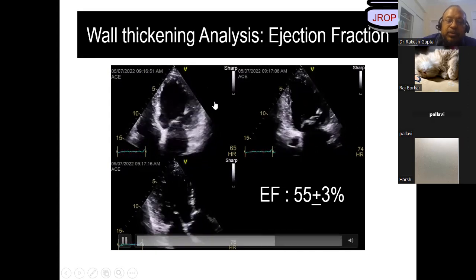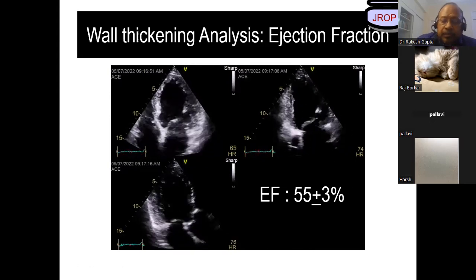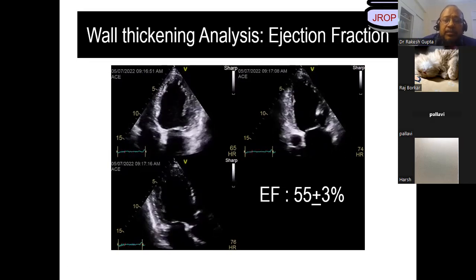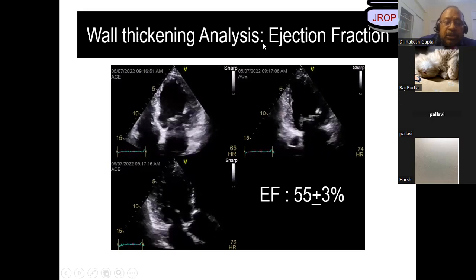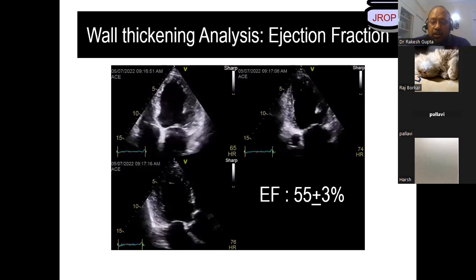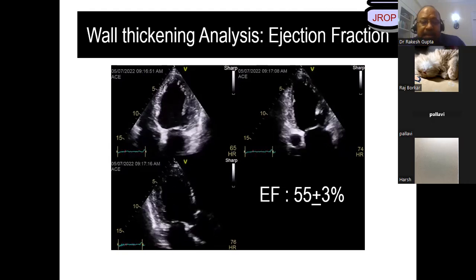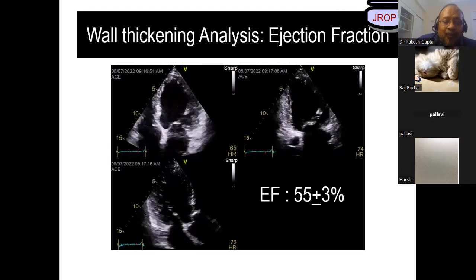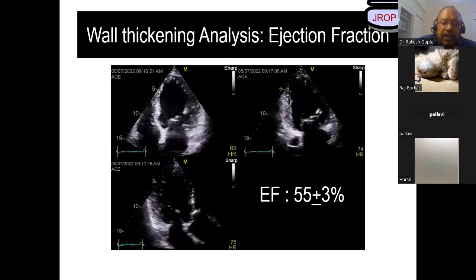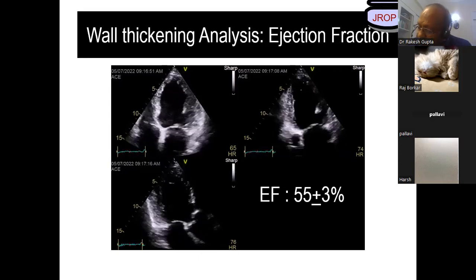So as far as MAPSE is concerned, whether on medial or lateral annulus, this is just a gross idea of what kind of ejection fraction we are dealing with. It's used the majority of the time in patients who have poor echo windows, and we cannot look at a good ejection fraction in that subset of population. Like in ICU, patients on prone ventilation. Just get a probe and look at MAPSE and other factors to give you a rough idea what the ejection fraction is.